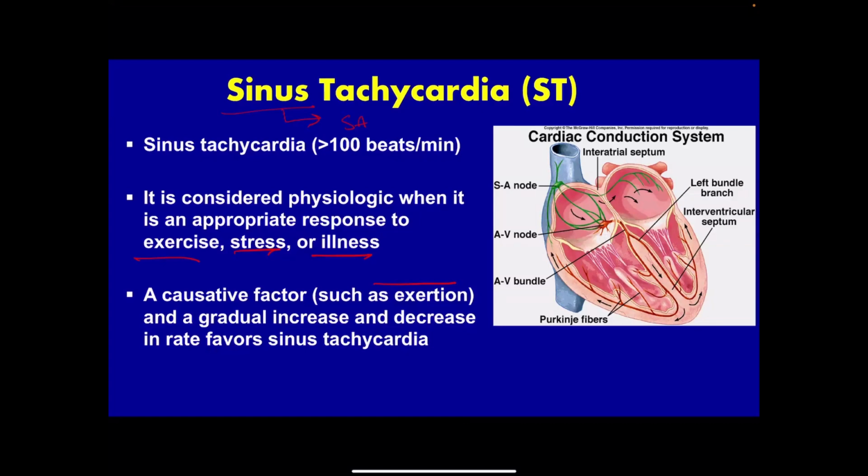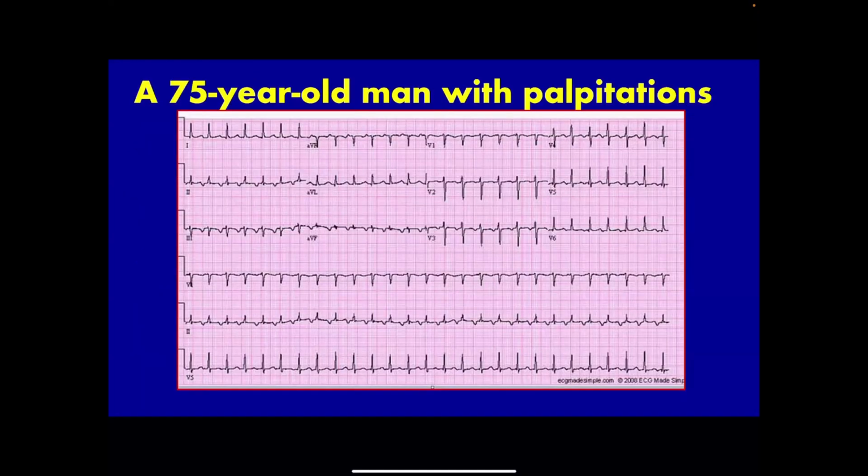No. Okay, now try this one. Have the table next to you. If you have the table next to you, it will help you solve this. Who wants to try to solve this? Okay, we can do it together.